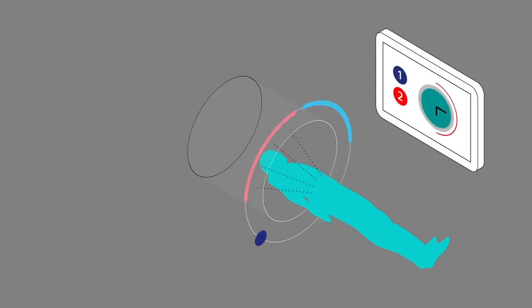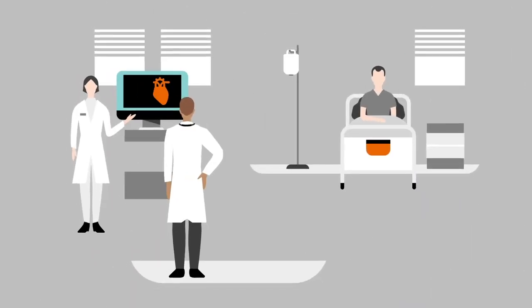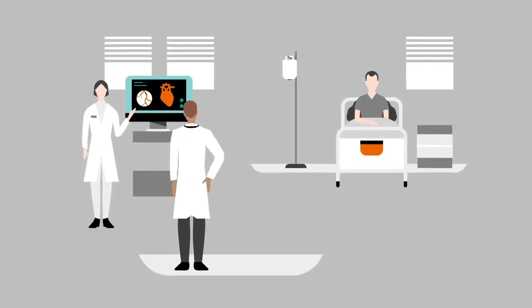Two X-ray tubes make the sectional images in half the time, so it's even possible to get a clear image of a rapidly beating heart. On the basis of the 2D or 3D images, the radiologists reach a diagnosis. They then discuss the findings and therapy recommendations with their medical colleagues.